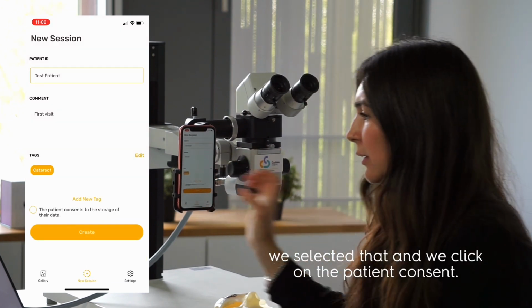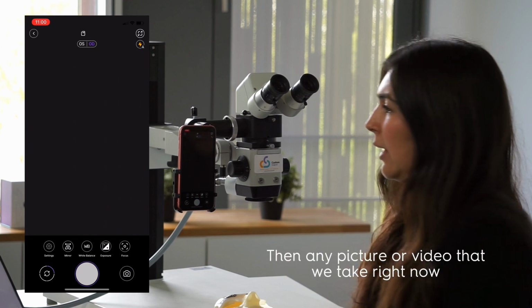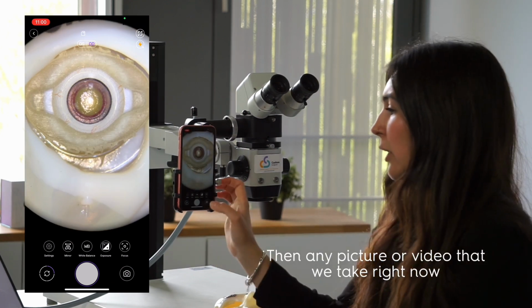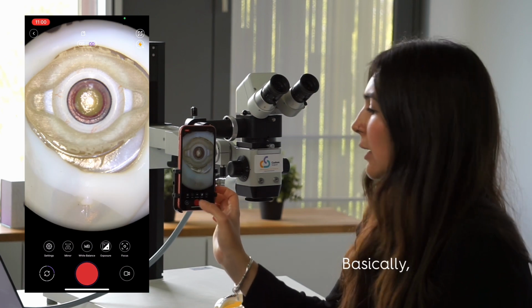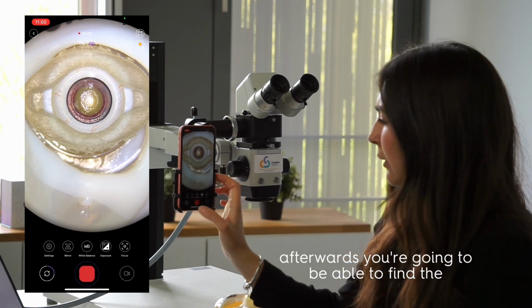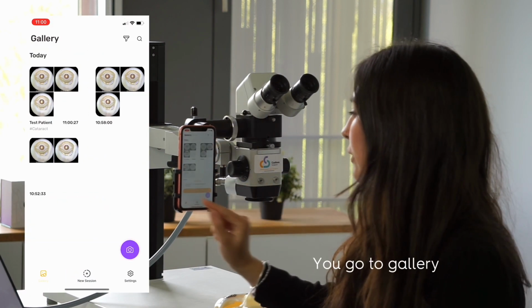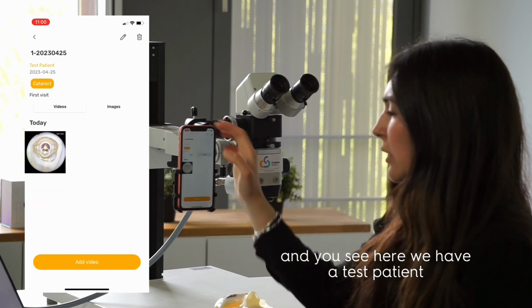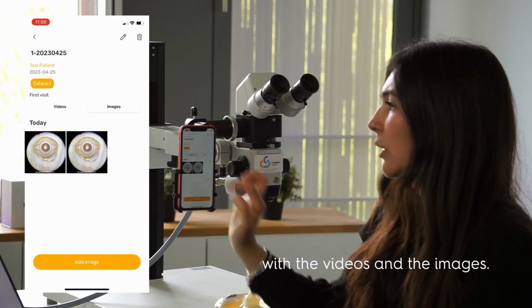So we select the tag, we click on the patient consent, and then any picture or video that we take right now, it's gonna be assigned to that session. So basically afterwards, you're gonna be able to find the data belonging to that patient quick and easy. So you go to gallery and you see here that we have the test patient with cataract first visit with the videos and the images.